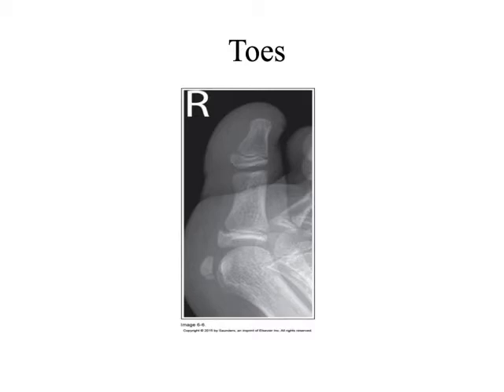But the reason that we know that it is lateral or oblique, in part, just looking at this image and describing what you see, how can we make the determination that this is probably a lateral or oblique? Looking at the anatomy and what we see demonstrated on this image. I can see a sesamoid bone. What else? There's some superimposition. What else?